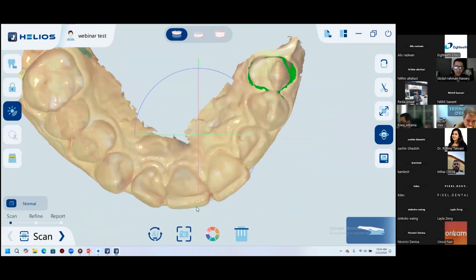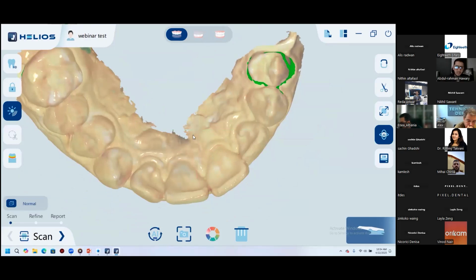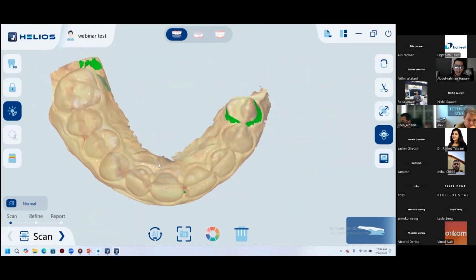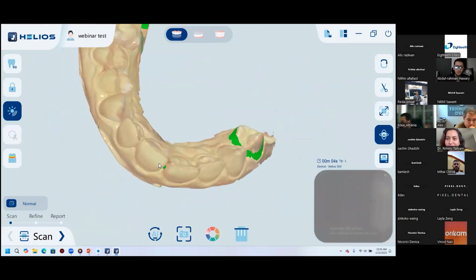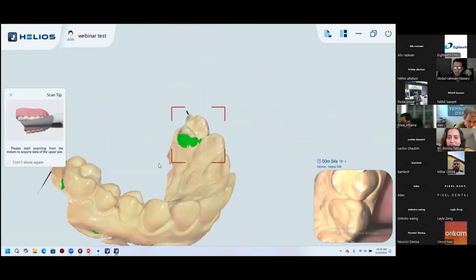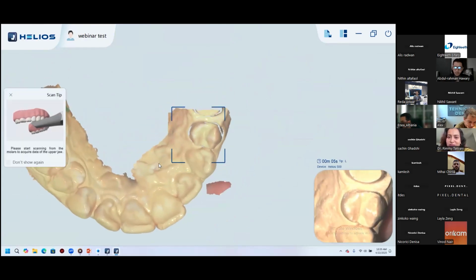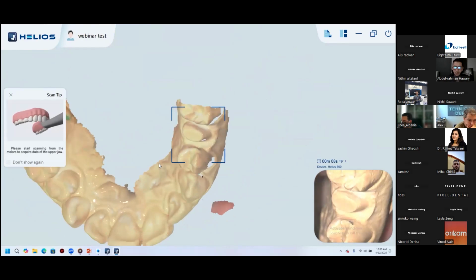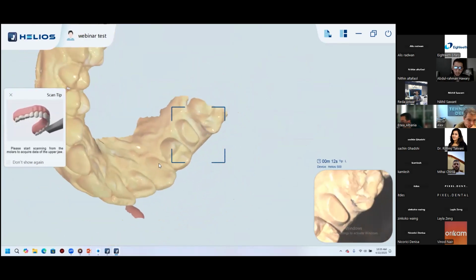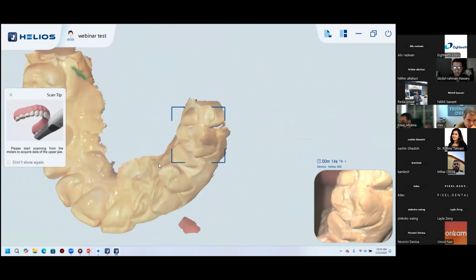through the model does create some double imaging because it's a model. It's showing a stitching error. Yeah, wrong stitching, and the AI automatically eliminated it again. So you could just give it another try. But this usually happens with models. But now with the AI capabilities, it will automatically cut it out again. You don't have to cut it out again. This is the overlapping and the double imaging.